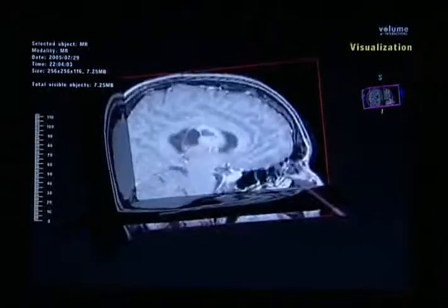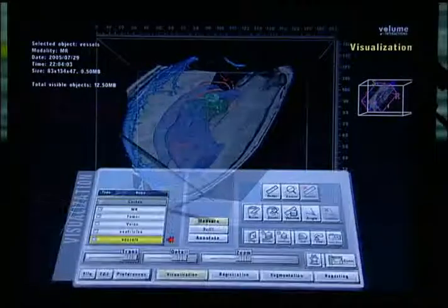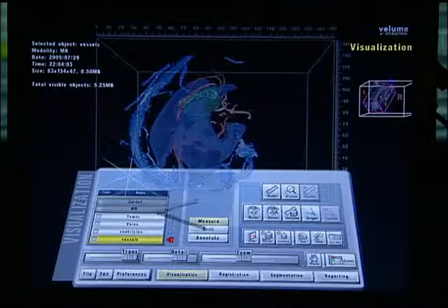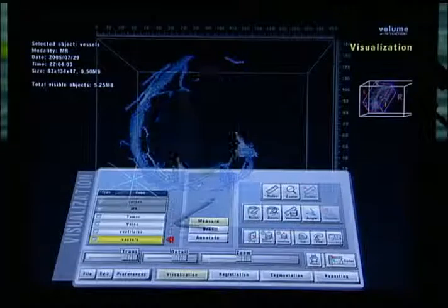And this is sort of the way you would see this tumor if you were looking at 3 cuts of MR. You have an idea of what you can see. What Rolf has basically done is he's taken this thin cut MRI, which is a plus, and seeing what he can do with it. How can you better visualize this tumor based on a routine MR in space?